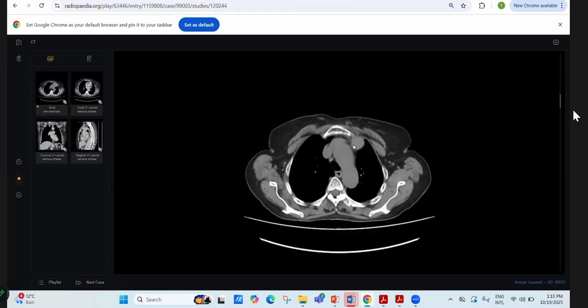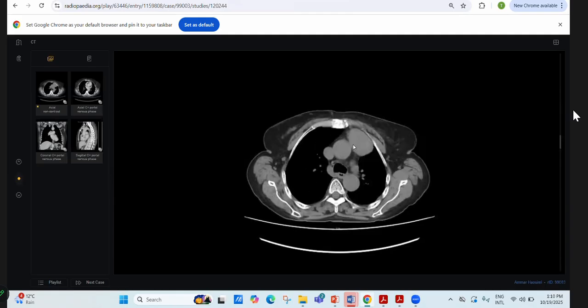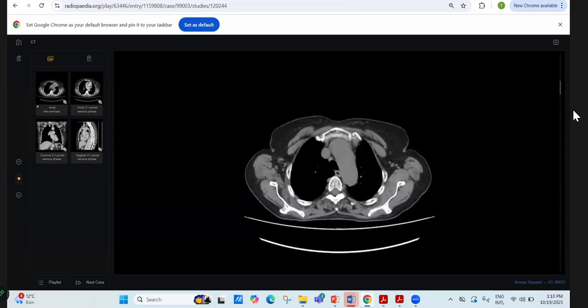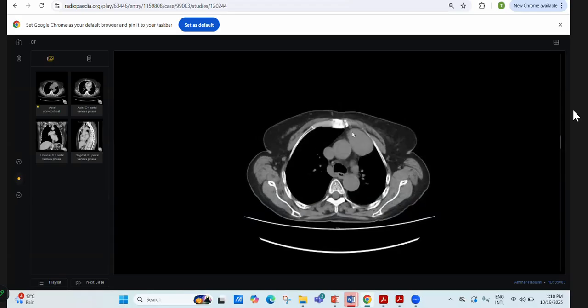Okay, and this was thymoma. You did pretty well, candidate three. Straight away, this was thymoma. But the only objection here is that first of all, you mentioned there's an area. Don't use those words which can create problems for yourself. If it is a mass or lesion, say it is a mass. Don't say area and then reach the lesion. In the first instance you said area. It's a proper well defined mass.